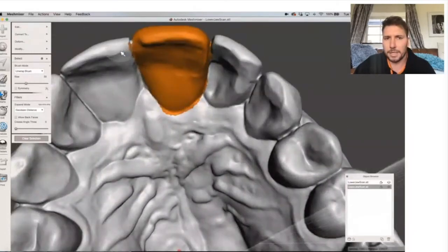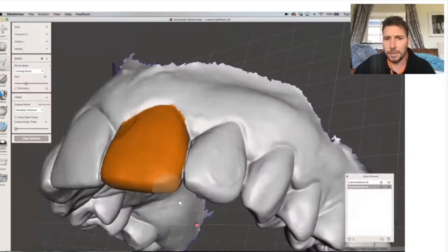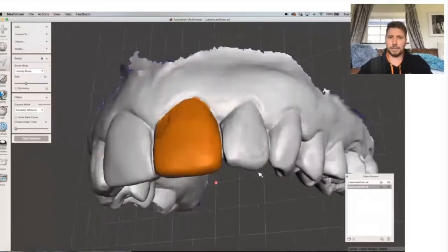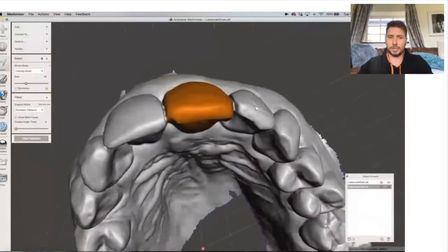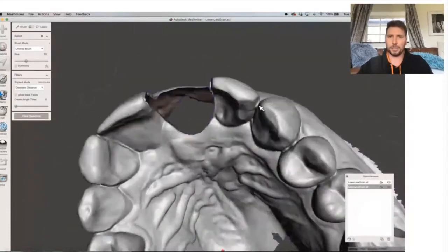And then deselect. And what am I doing to deselect? I'd ask you, but I can't hear you. So I'm holding the shift button and doing the exact same thing, holding the left click down and going over it. Now, to delete, really nice and easy, all we do is press X. There we go. And it's gone.